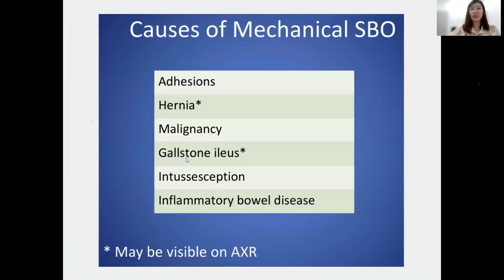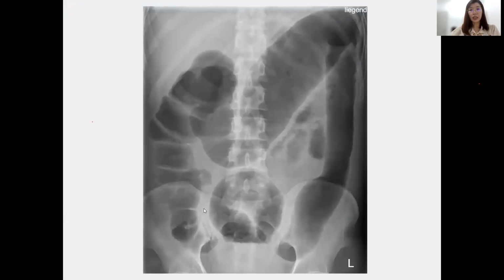Then intussusception in a pediatric patient, or inflammatory bowel disease. These are easy ones. What's the diagnosis? Very easy.